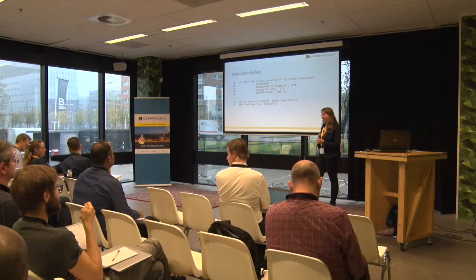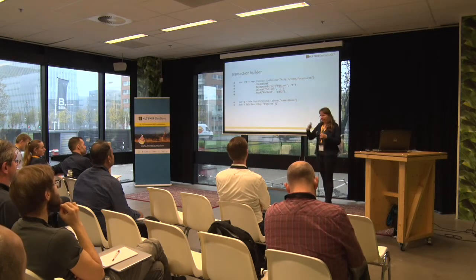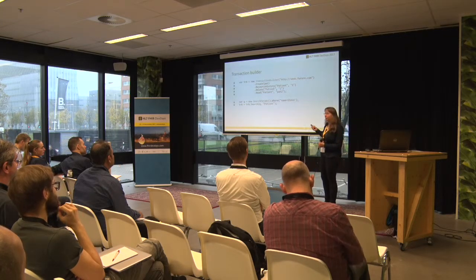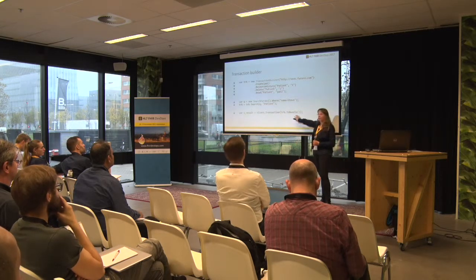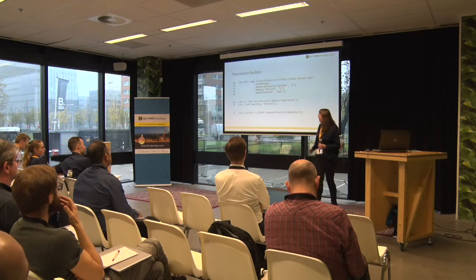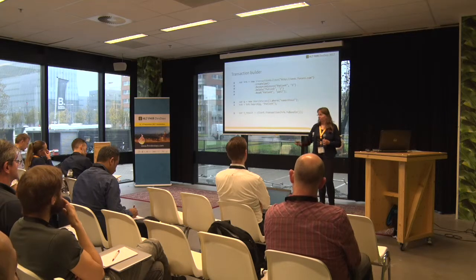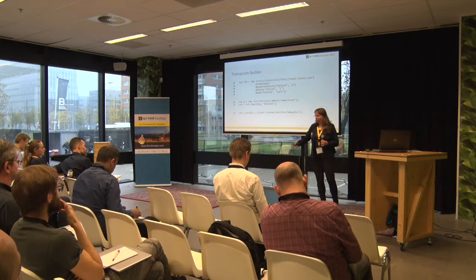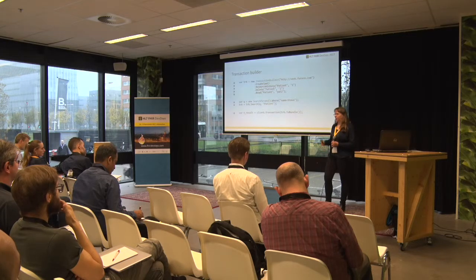Is it executed in sequence or simultaneously? No, it will create a transaction builder in memory, and then I can convert that to a FHIR bundle. If I want to send this transaction to a server, I will have to create a bundle first. That's with this method, and then I can send that with the transaction method to the server. The server will then know it will receive a transaction and will then be able to read the bundle, which is just a FHIR bundle constructed through the transaction methods with the transaction things inside.